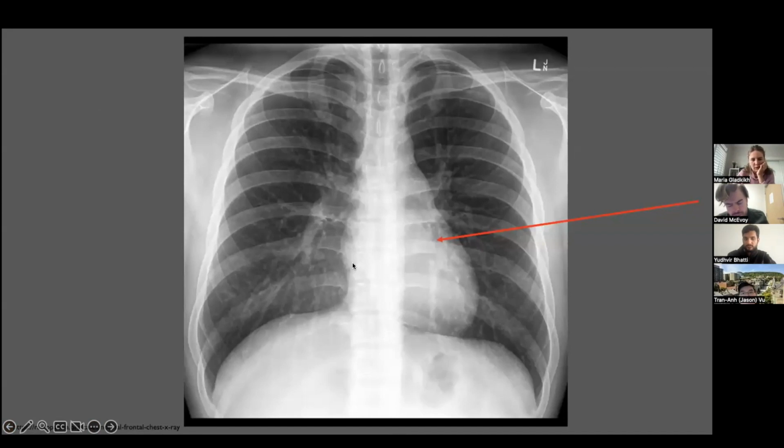Okay, I see left main bronchus. So this one's a bit more tricky. I'll go through the anatomy again a bit later, but for this one specifically, if you look at this, this is the trachea coming down, right? You have your right main bronchus, and then you have your left main bronchus. The right is a little bit higher over here. But then the left, if you look really closely, you can see that it splits into two. So this is your left upper lobe bronchus, and then it splits into the left bronchus intermedius, which is then going to subsequently split into your lingular and then your left lower lobe bronchi that are feeding these two parts of the left lung. So this is actually the left bronchus intermedius.